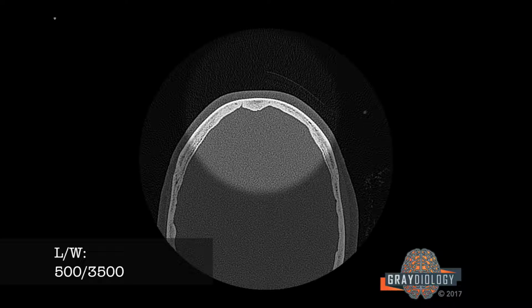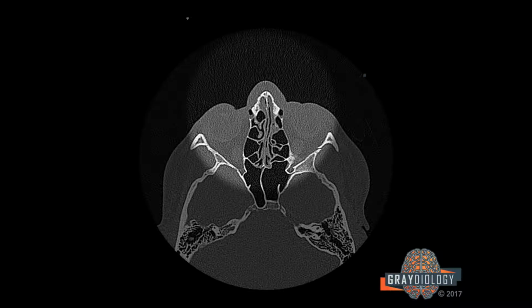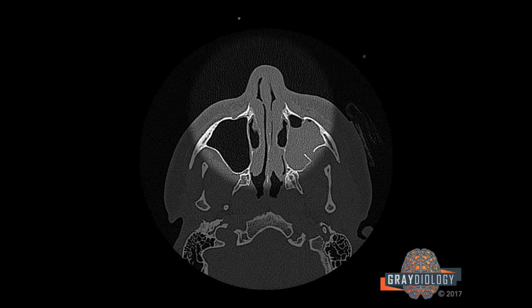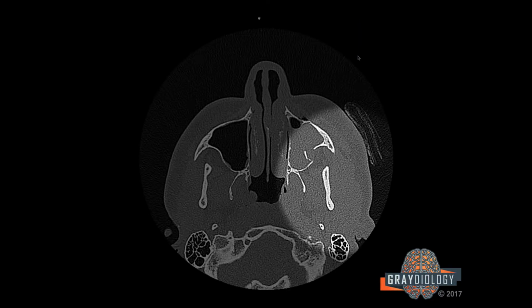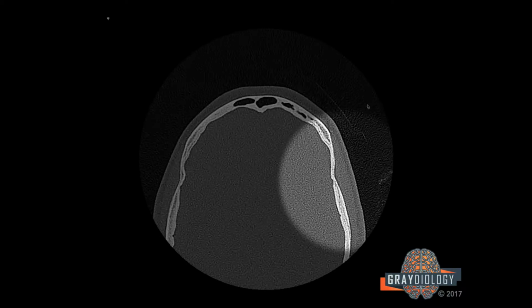So let's begin. I'll start at the top and I'll look at the superficial soft tissues, and I go front, go down, and I'm just making a note. Oh, look, there's soft tissue thickening over the bridge of nose and left nose. Keep going down, down, down, down. Then I'll look at the left face, and as I'm coming up, I see a bandage and I see a skin laceration. Then I keep coming up.